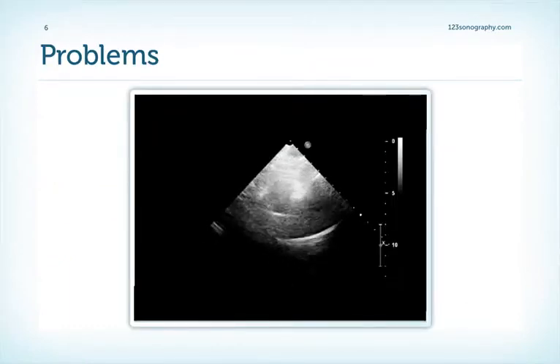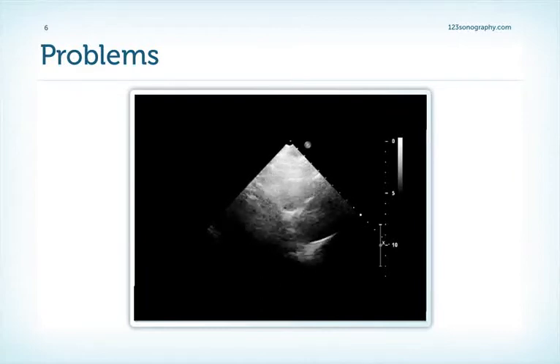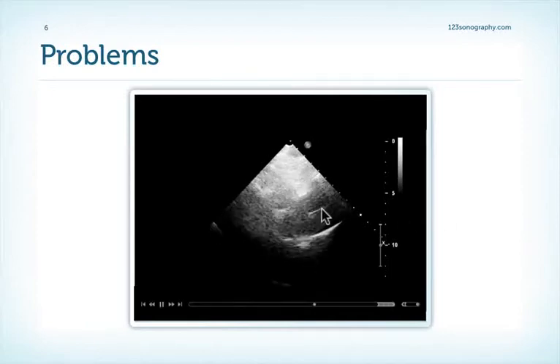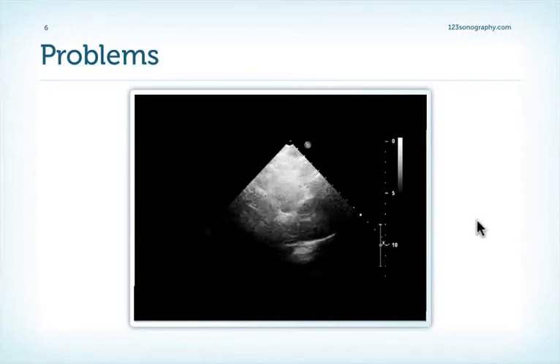I would like to tell you a story. Many years ago, I was called to a patient who had acute chest pain, and the question was what the cause of chest pain was. Now, he didn't have any ECG changes and he had no regional wall motion abnormalities, but what I found was linear structures in the ascending aorta. This is not the same patient, but a patient who has just the same finding.